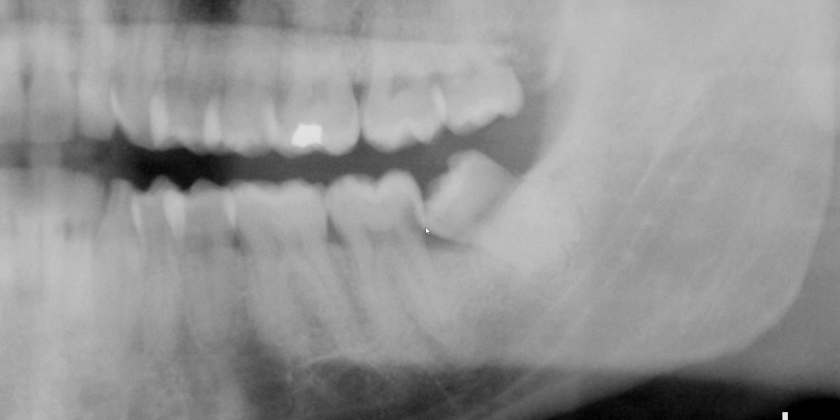And this is relatively common when the tooth is partially erupted and impacted in such a manner that the food can easily be impacted or dislodged underneath, and then that can cause the decay or decalcification of the tooth. Because this area, as you might imagine, is very difficult to clean because of impaction. So that tooth needs to be really removed.